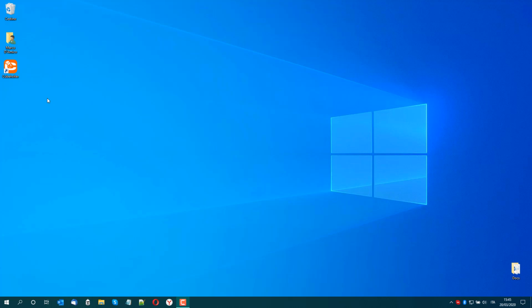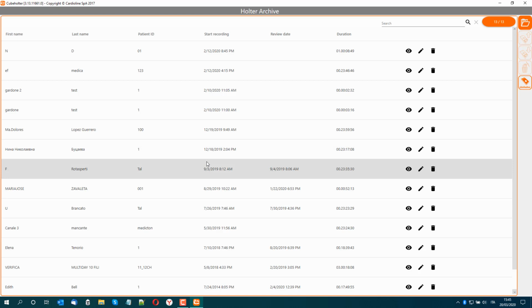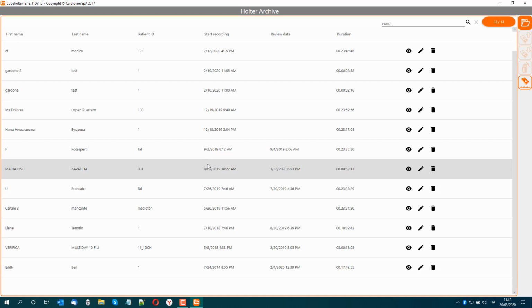Okay, with this short video training, we are going to see how to use and configure CubeholterNG of CardioLine. So, by double-clicking on the icon on the desktop, the software archive opens. Here I have the list of exams.